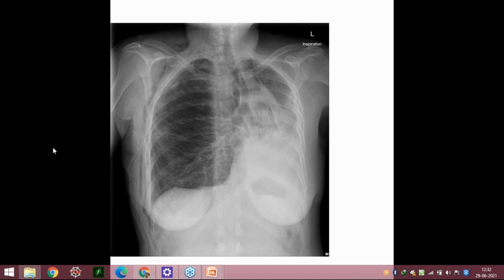So yeah, silicosis can cause fibrosis, tuberculosis can cause fibrosis, sarcoid can cause fibrosis. Upper lobe fibrosis would be the first differential. Adhesion is not right. Tumor will not have such a drastic drift of the mediastinum.